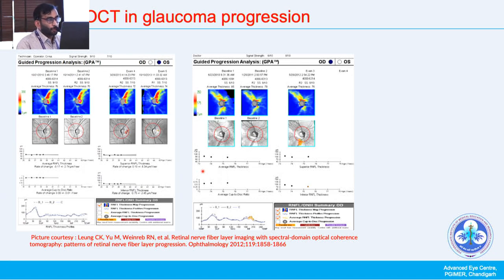It can be used for progression. You can scan with the machine and keep adding more data, and you can get the glaucoma progression analysis. Even if you don't have progression analysis, you can follow the scans.